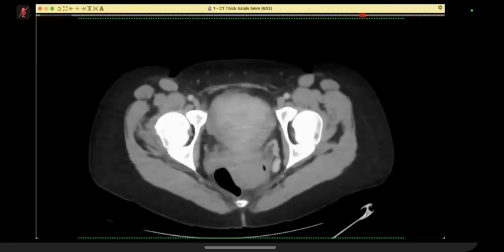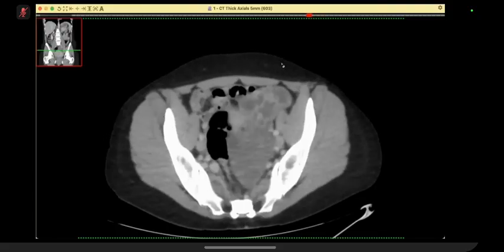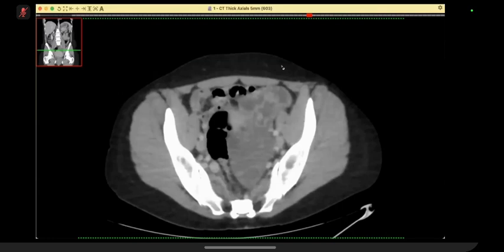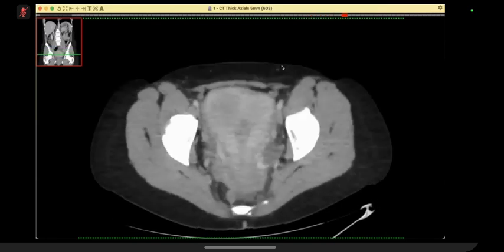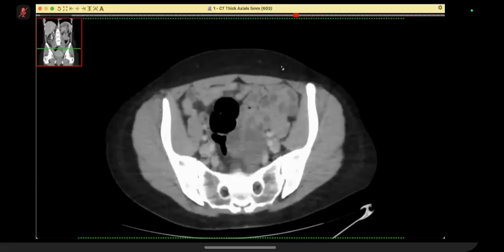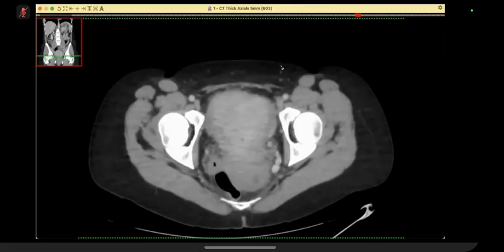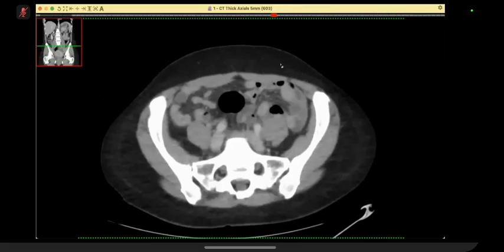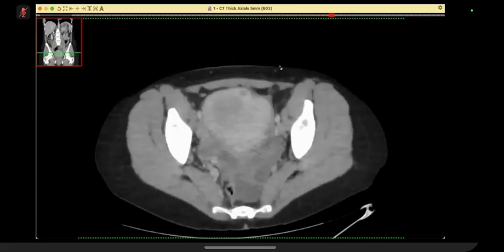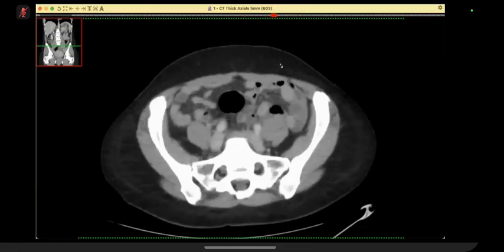This is CT contrast abdomen and pelvis in a venous phase. There is a mild pelvic collection, and the uterus is bulky. The left adnexa also is bulky. I am just of concern if there is an ovarian torsion.